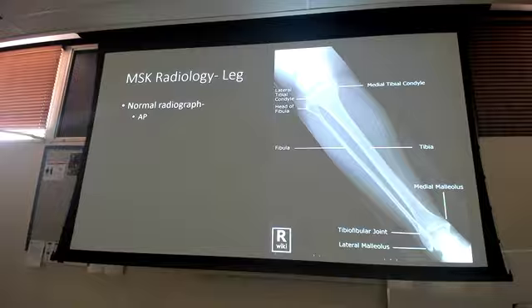Okay, so they're two long bones. Don't get tied up again with the shadows at the ends of the bone, right? They go over each other, so you've got to trace that cortex well so you don't get tricked into thinking that this radiolucency here in the tibia is actually a fracture. It's just the way the shadows are presenting because the fibula is sitting right there, and the cortex of the fibula right next to it makes it look a little bit darker. It's really not. Those are superimposed on one another, so those areas are actually more radio-opaque.